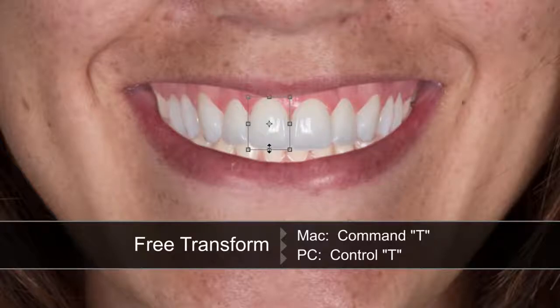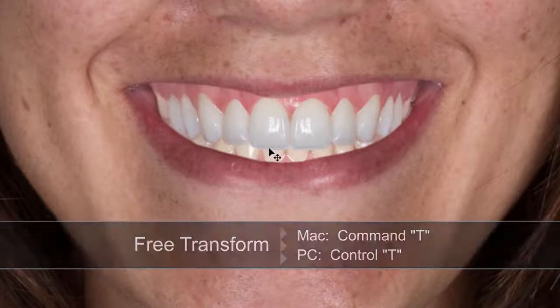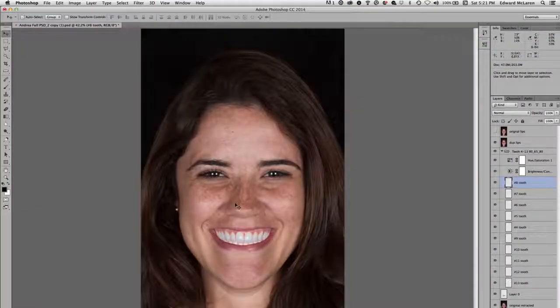Again, these are all the little discussions you can have with the patient. All right, now let's zoom back out. All right, now at some point I'll say, then I'll just show, here was before, here's after. So I'd like to lift your gums up a little bit.